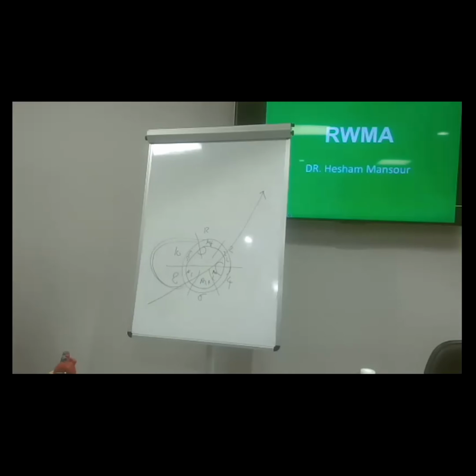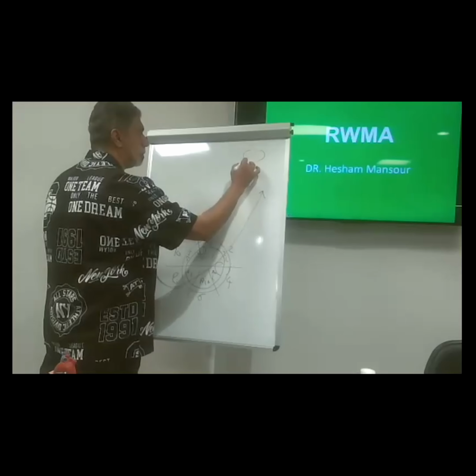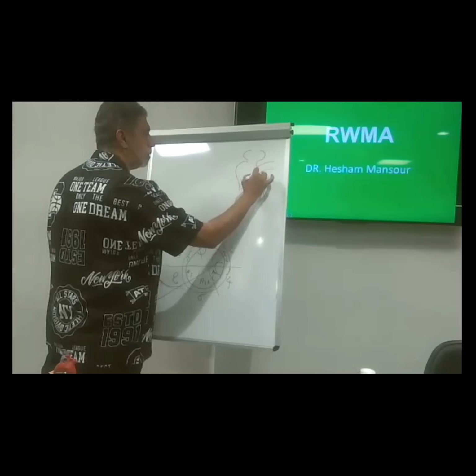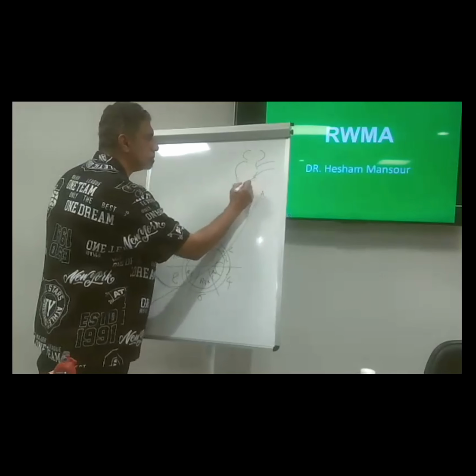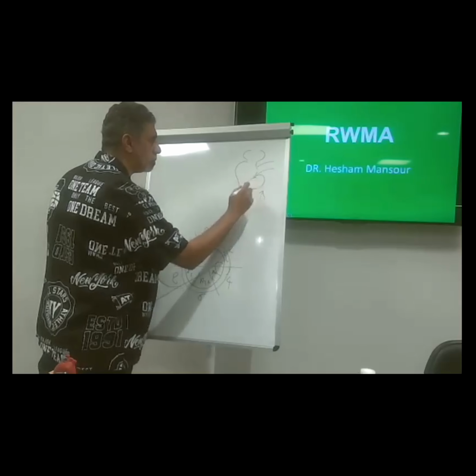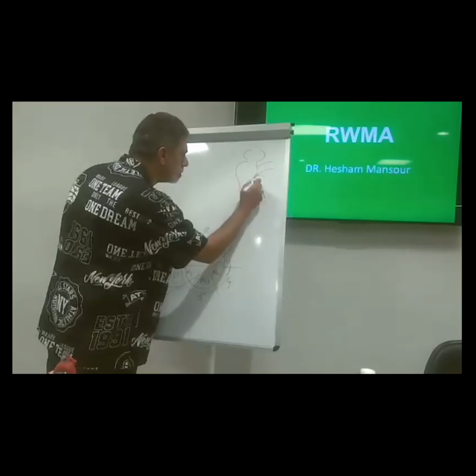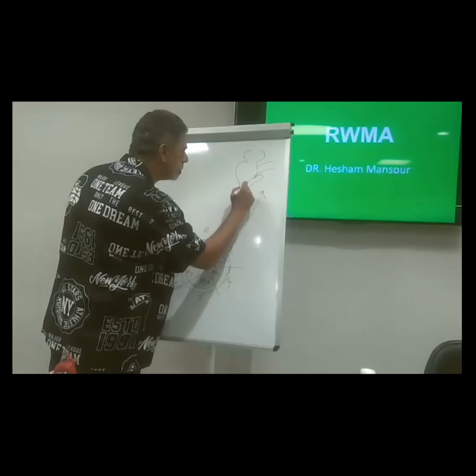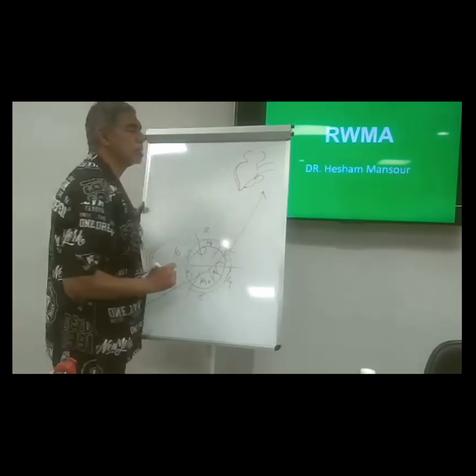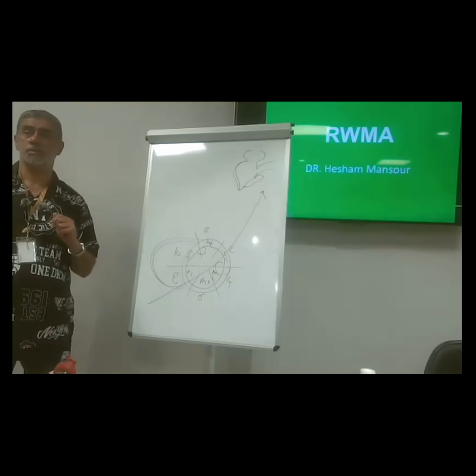Do you know what we'll get? We'll get this. What's this? Excellent.